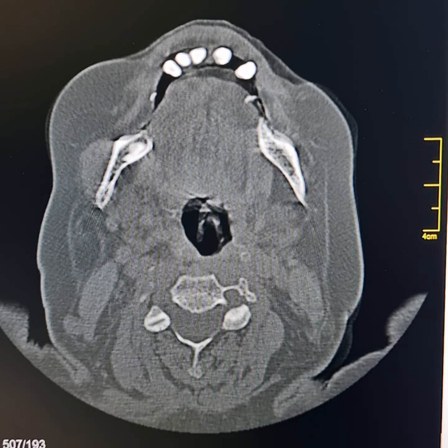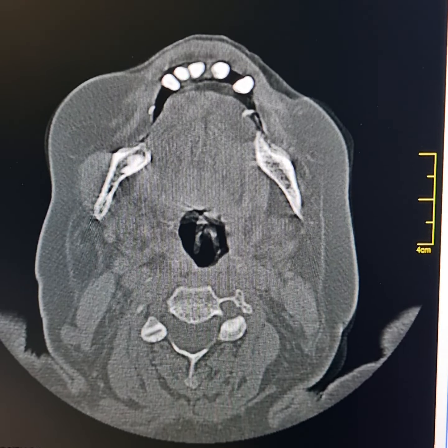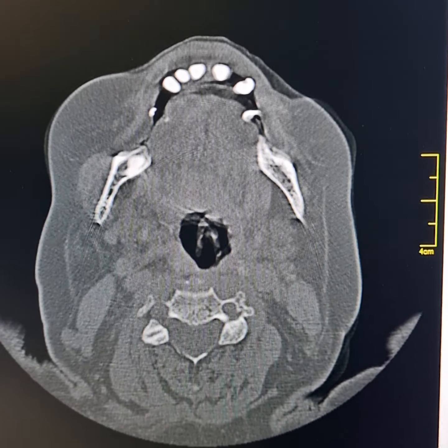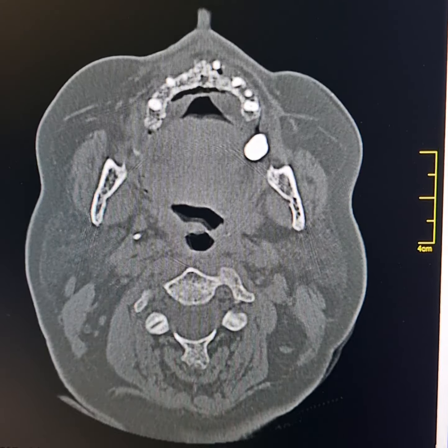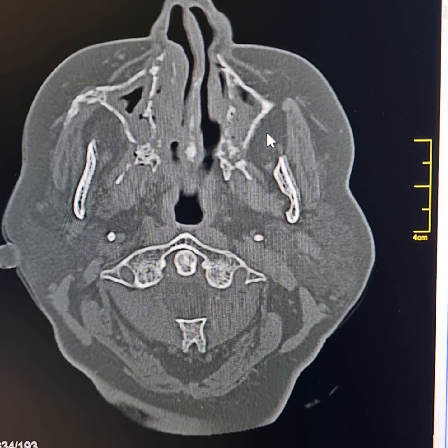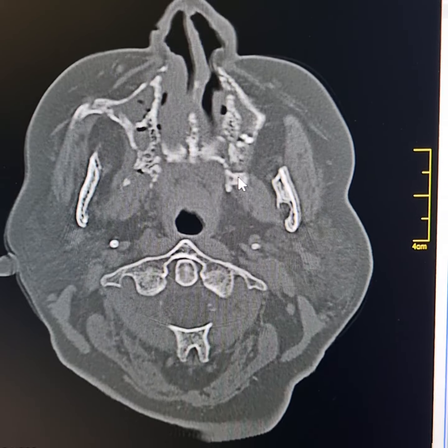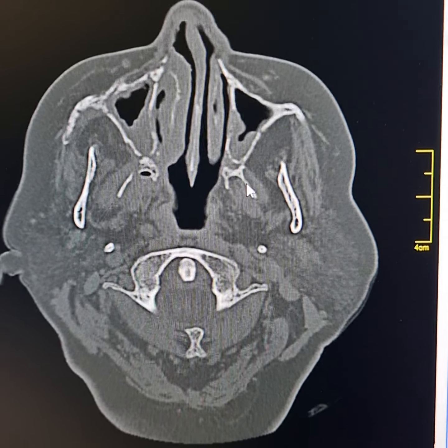This is a plain CT scan of face and paranasal sinuses of a 68 years old female patient. She is diabetic and a known case of mucormycosis. Ill-defined erosions are present involving superior alveolar arch, both maxillary bones, both pterygoid bones and their plates.